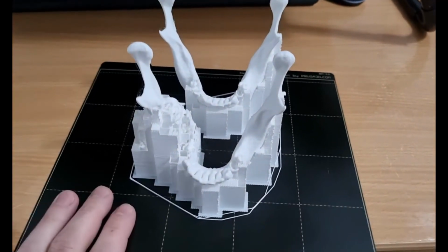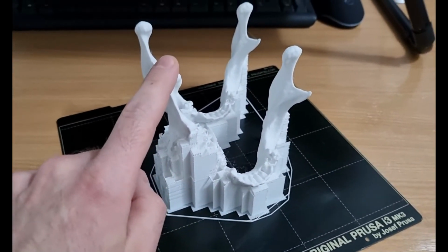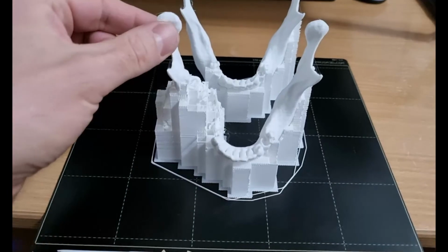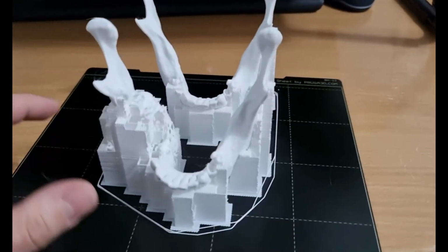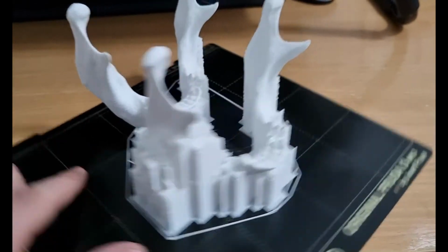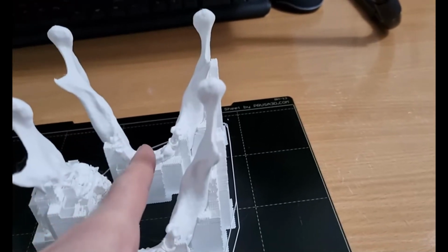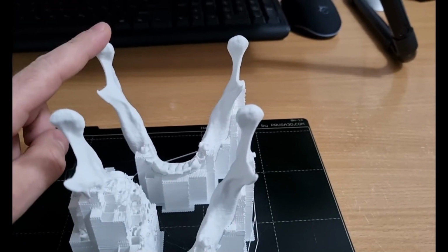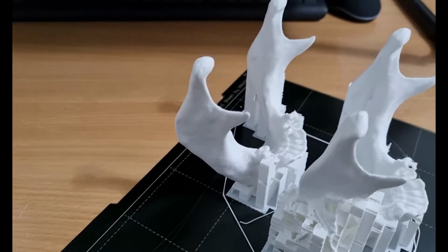So these are two mandible models after the 3D print. The first one is the original native mandible with the tumor. It will be used to discuss with the surgeons where the osteotomy planes will be, the front osteotomy and the more dorsal osteotomy. And the second one, the back one, is the mirrored one in the sagittal plane. It will be used for forming the plate, for pre-bending of the connection plate.